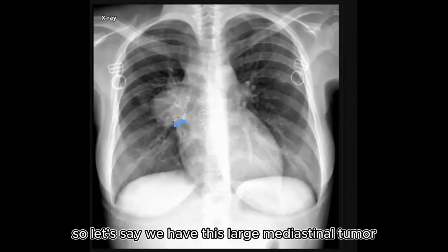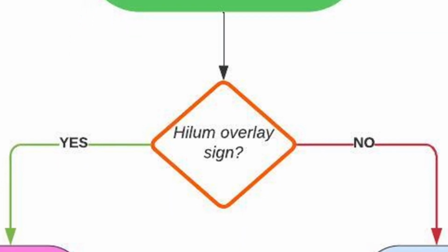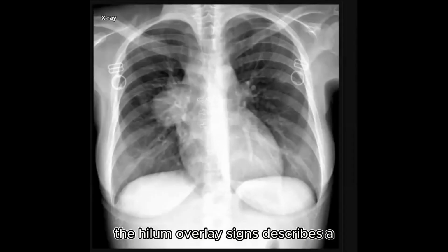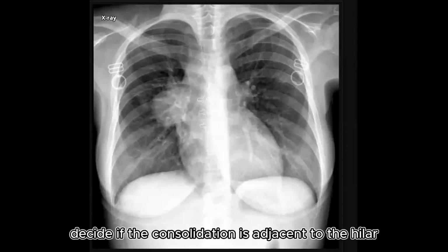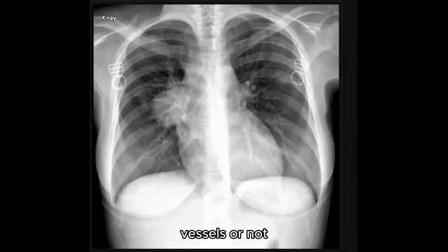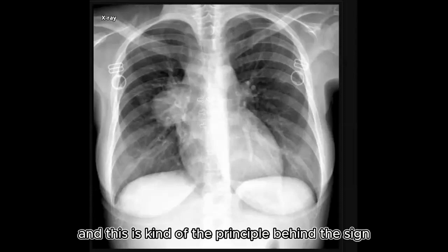So let's say we have this large mediastinal tumor. The first thing we're going to look at is the hilum overlay sign. The hilum overlay sign describes a useful sign on a frontal projection that can help us decide if the consolidation is adjacent to the hilar vessels or not. You probably heard of the silhouette sign, and this is kind of the principle behind the sign.